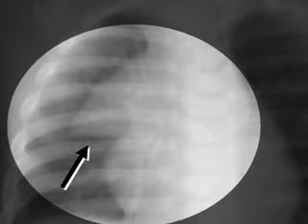The black arrow is pointing to the thymus, which is resting on the minor fissure. Because the thymus is so soft, the minor fissure produces an impression on the thymus gland, which you see here. Notice that the thymus gland is not separated from the heart, as it is in the Spinnaker sail sign of a pneumomediastinum.